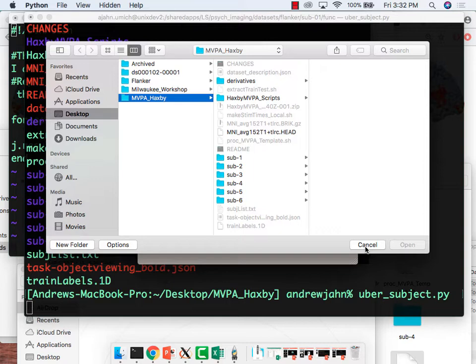I'm thinking, the reason that I want to warp it is if we want to use an atlas, that would be useful. Now, you could analyze it in single subject space. If you remember, we had a brief discussion yesterday about using this XMAT transform that contains all the transformations, and you can use that to reverse something from MNI to single subject space. So we could do that, but I'm just trying to give us the option. I understand your logic, and that's understandable. You could choose not to do it. I'm going to keep it just so we have those options open.